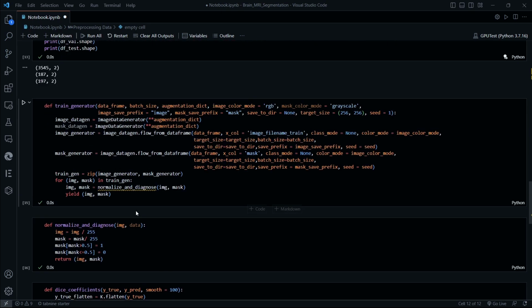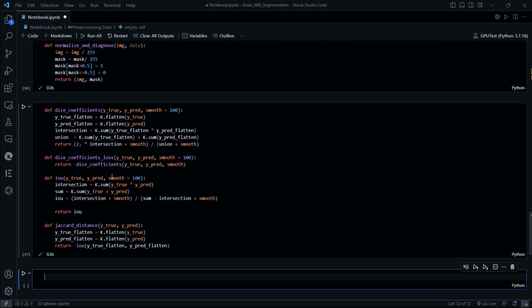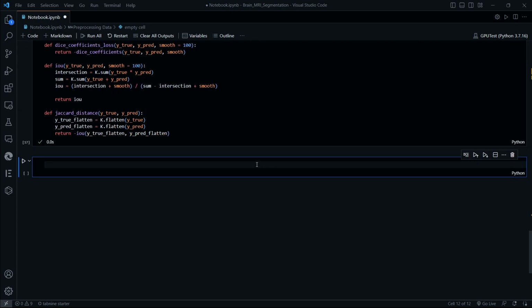So in this video what we learned is how to generate and augment our data and how to create a function that would do that. And in this section we have learned about dice coefficients, IOU, as well as the Jaccard distance. So let's see now what is the next part.